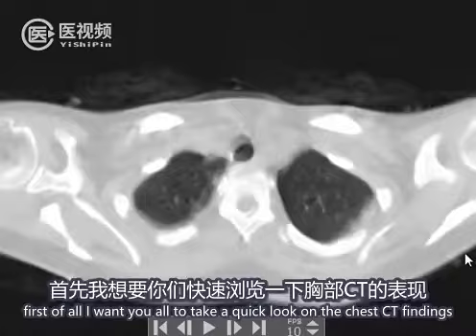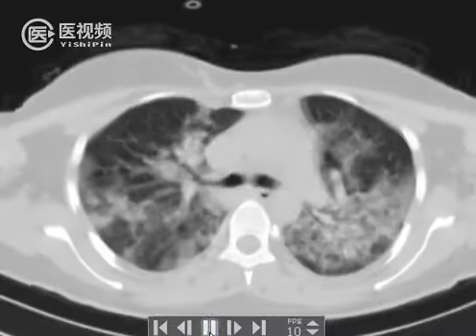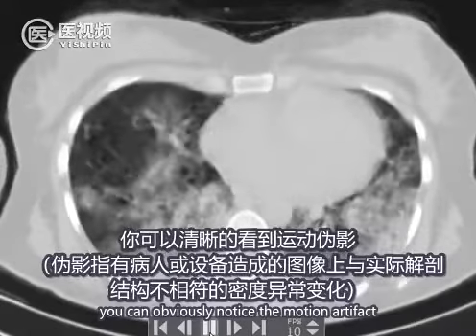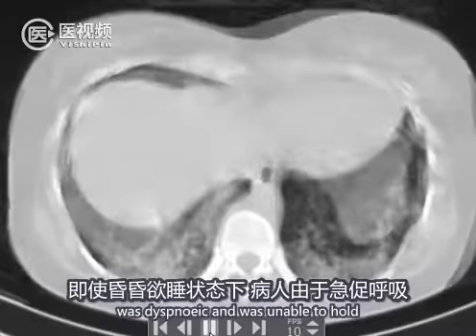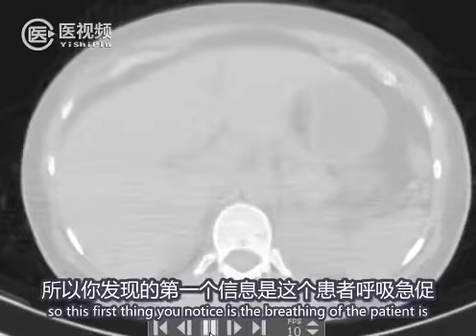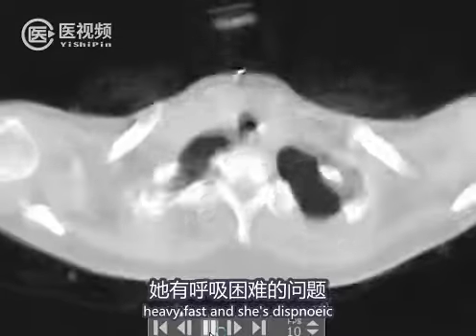First of all, I want you all to take a quick look at the chest CT findings shown here. This is the lung window. It was a CT without contrast. You can obviously notice the motion artifact due to the rapid breathing. The patient was dyspneic and unable to hold her breath, and even a little bit subconscious, drowsy. So the first thing you notice is that the breathing of the patient is heavy, fast, and she's dyspneic.